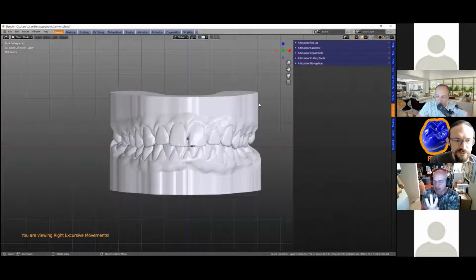I think there are 3 cuts going forward, and then three cuts lateral, and then 3 on the other side, right? Because we don't really need more than that, since it's spaced like 0.5 millimeters apart or something. More than that would be overkill, and it avoids making holes in the model. Sometimes I used to animate all the motion in one timeline. I was asking myself if I can cut all this animation, but for the moment it's specific for each motion and it's only 5 cuts.